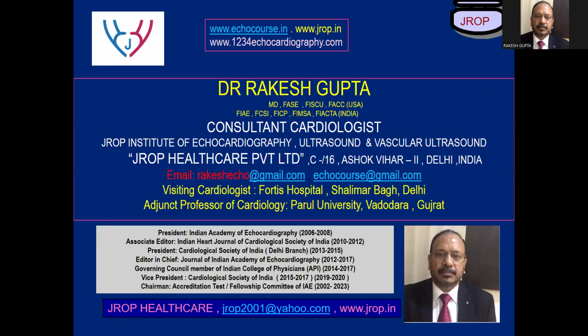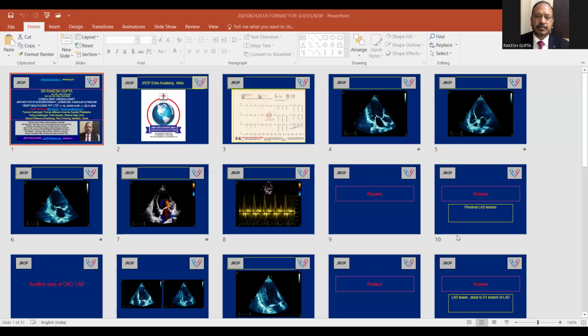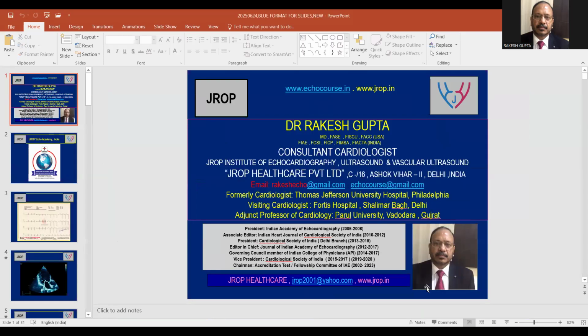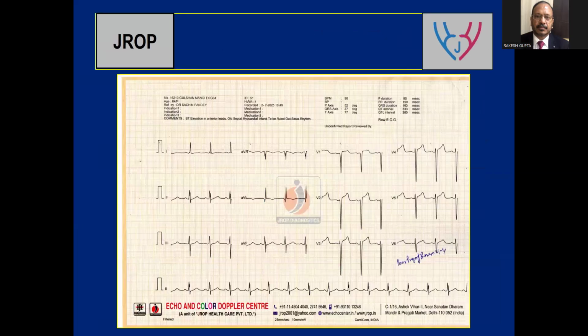With these few words, let me just present a few cases of wall thickening abnormalities. I'll just take about 5 to 7 minutes before my colleague, Dr. Debika Chatterjee, joins for diastolic function evaluation. Here are a few presentations of wall thickening abnormalities, which I did a few days back. I've tried to incorporate this along with the video record, along with the ECG.